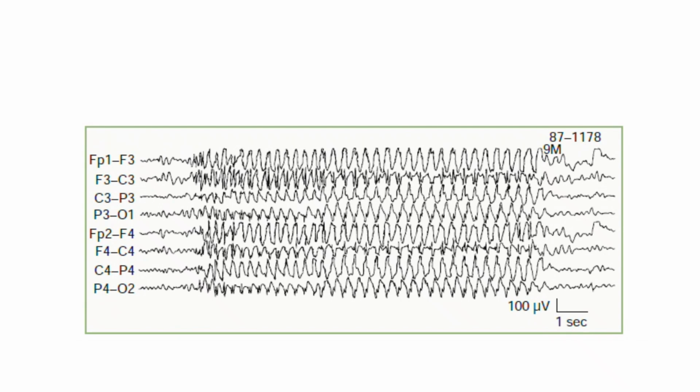2. Calculating the frequency. Let's look at the calibration scale at the bottom right, 100 µV, over a 1-second time interval. If you isolate any single 1-second interval during the run of the seizure and count the number of sharp spike and slow wave complexes, you will count exactly 3 cycles. This rhythmic 3 Hz spike and wave frequency is the pathognomonic hallmark of classic absence, petit mal, seizures.